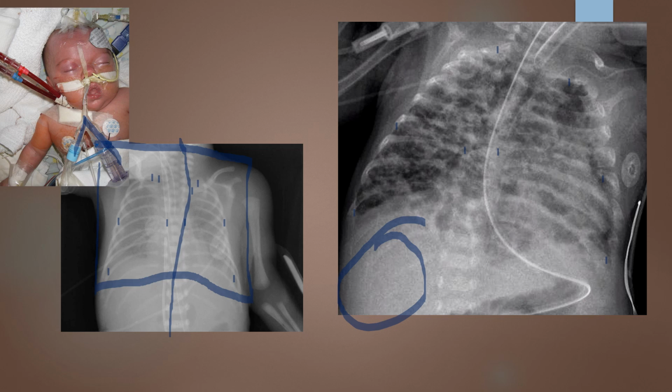If I come up here, if I could identify, which I really can't, the sternoclavicular joints, here's a clavicle, so here's an SC joint, and I can't see this one over here, but this one's far, far away. So that would be my patient's right SC joint is away from the vertebra. Hold on a second, I'm sorry.